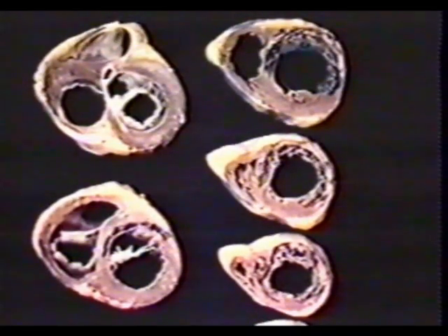These short-axis pathologic slices demonstrate regional involvement typical for a large anteroseptal apical infarct. All of the apical segments are infarcted. Moving toward the midventricular level, we note infarction of the lateral, anterior, and anteroseptal segments. And as we move to the basal level, there is involvement of the anterior and anteroseptal segments. This infarct resulted from occlusion of the proximal LAD.